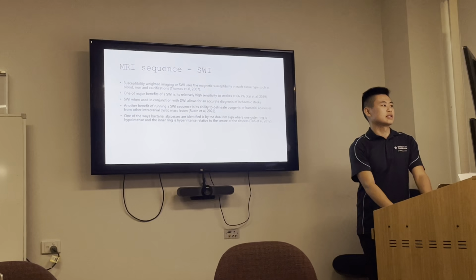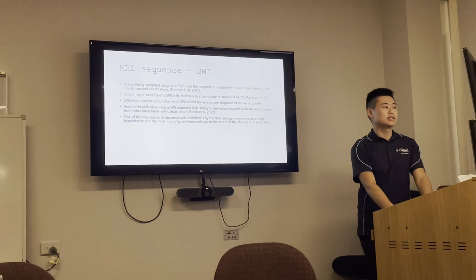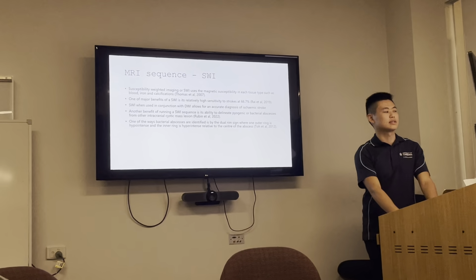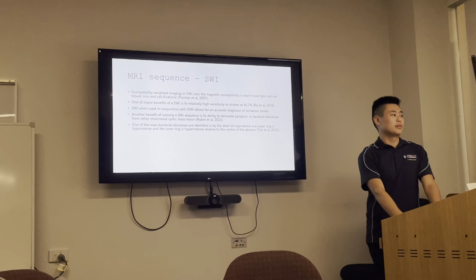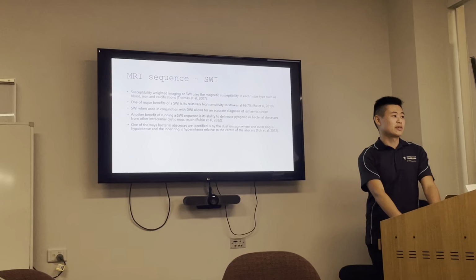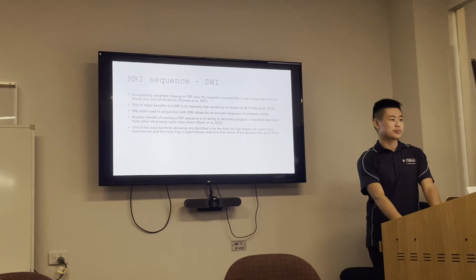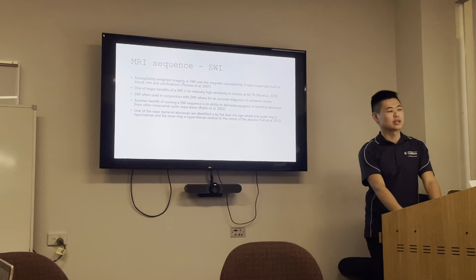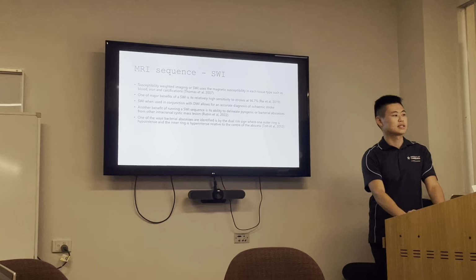Another benefit of running a SWI sequence is its ability to delineate pyogenic or bacterial abscesses from other intracranial cystic mass lesions. One of the ways that bacterial abscesses are defined is by the dual rim sign, where the outer ring is hypointense and the inner ring is hyperintense, all relative to the center of the abscess.